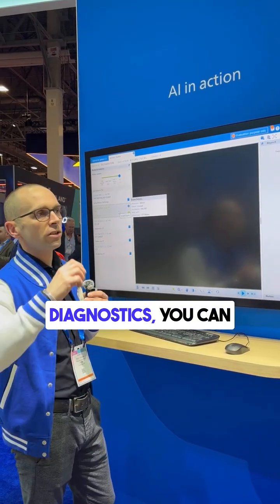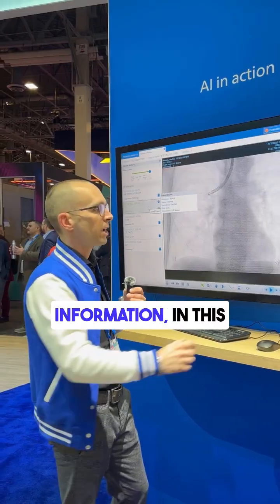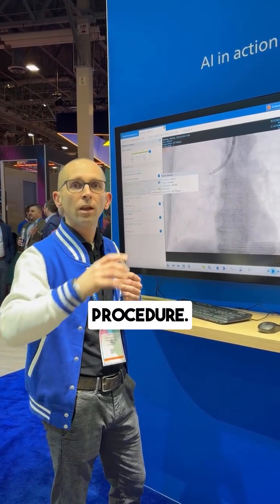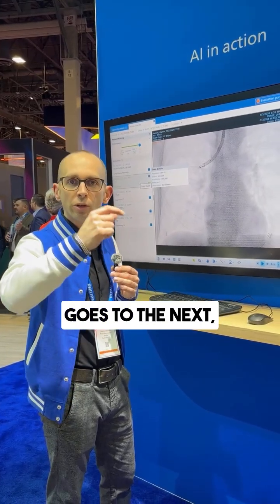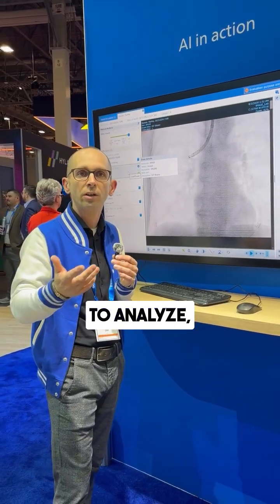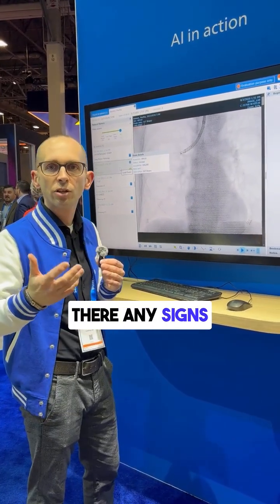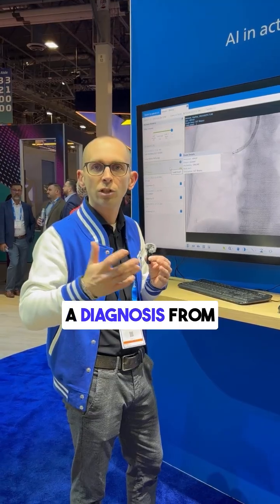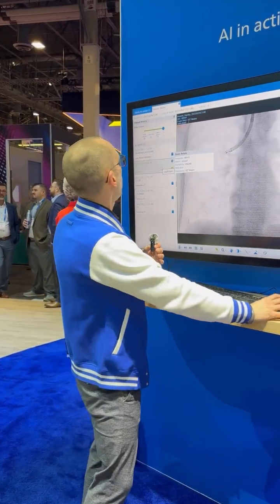Within Philips Integrated Diagnostics, you can also go to other diagnostic information, in this case, a short video capture of the biopsy procedure. The biopsy obviously goes to the next person in line, the pathologist. The pathologist needs to analyze the tissue. Are there any signs of lung cancer? What type of cancer tissue is it? And come to a diagnosis from a pathology perspective.